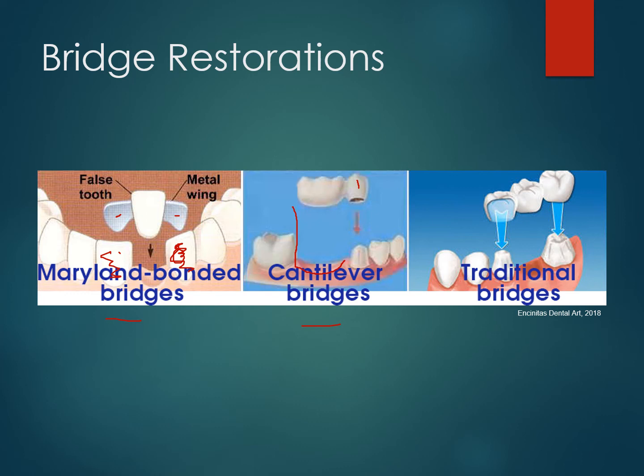It's not as perfectly stable as a traditional bridge is, and when you place something like this, I mean, you guys have all been on a seesaw, right? So if there's weight that comes down on this section, it will actually kind of tweak over here on this one. This side will actually come up a little bit, and it's going to cause that whole bridge to rock a little bit inside the mouth.